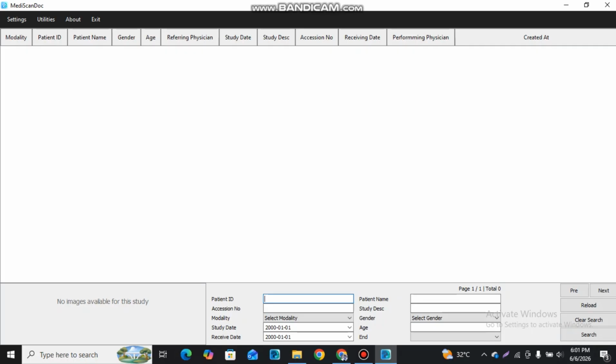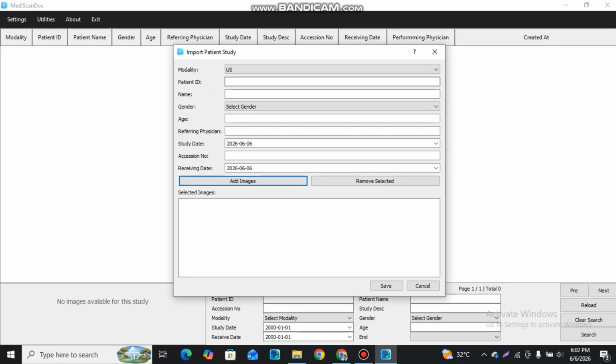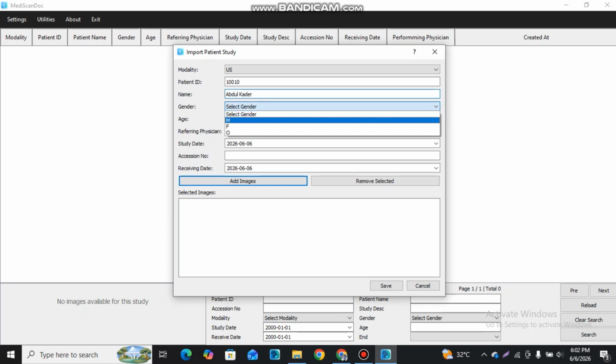Okay, now I will enter some patient information. Mail.